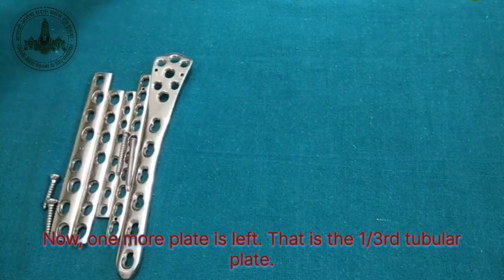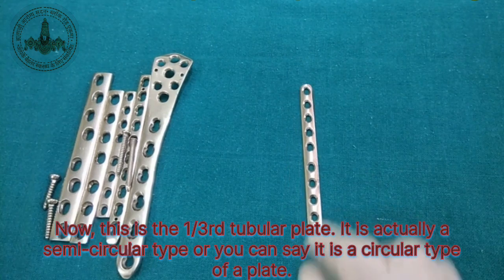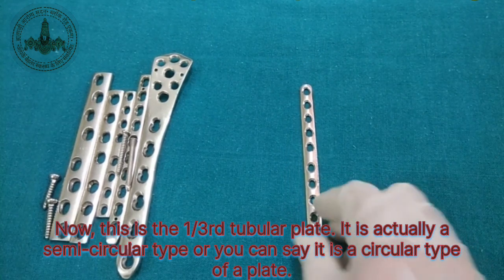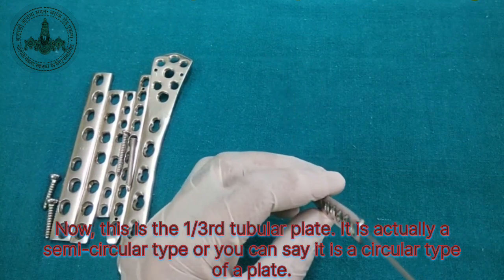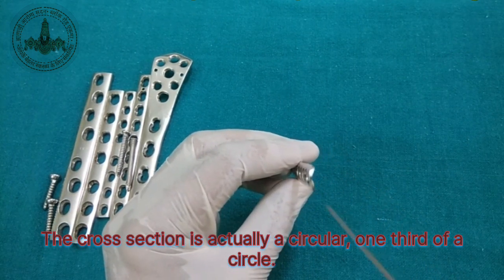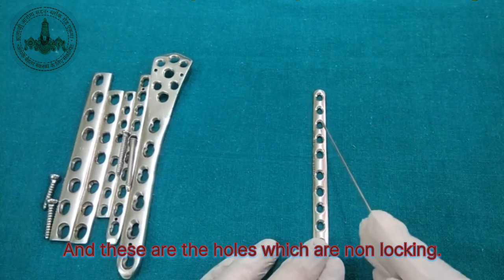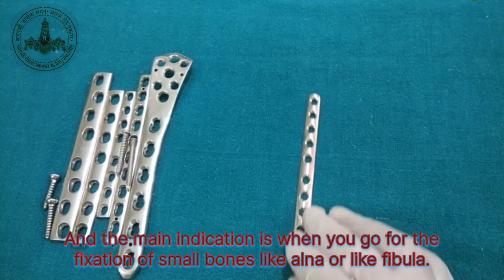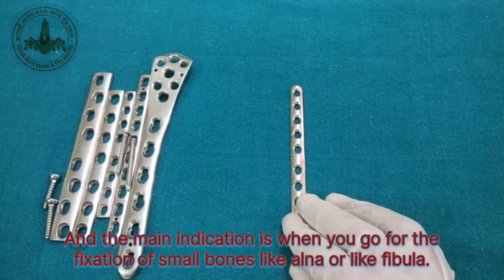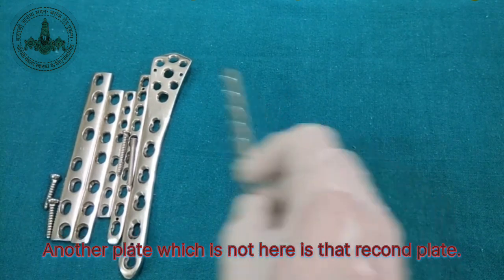Now one more plate is left, that is the 1/3 tubular plate. Now this is the 1/3 tubular plate. It is actually a semicircular type, or you can say a circular type of plate. The cross section is 1/3 of a circle, and these are the holes, which are non-locking. And the main indication is when you go for fixation of small bones like the ulna or the fibula, you can insert this type of plate. This is the 1/3 tubular plate.